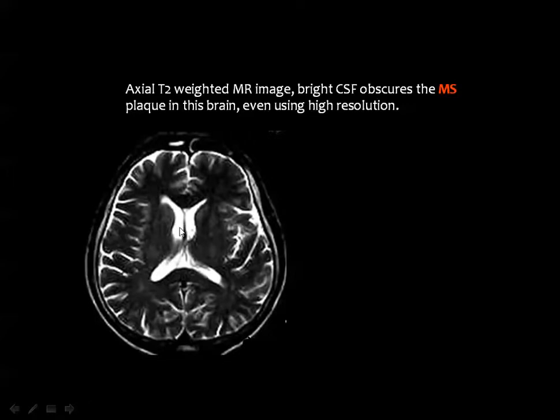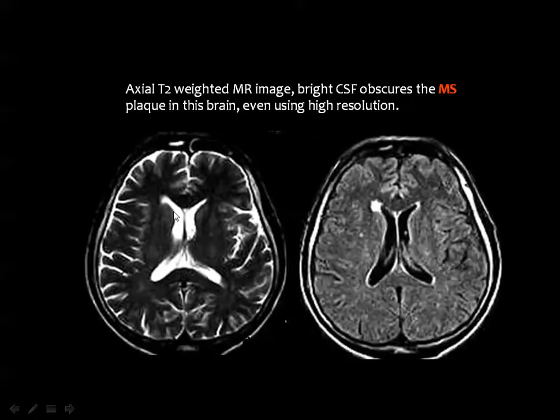And this lesion, because of its water content, will appear black in the T1, similar to the ventricle, and bright in the T2, similar to the ventricle as well. But look in the FLAIR image, and the lesion will appear bright because this is a T2 image, where the CSF will appear black because this is a fluid attenuation image.